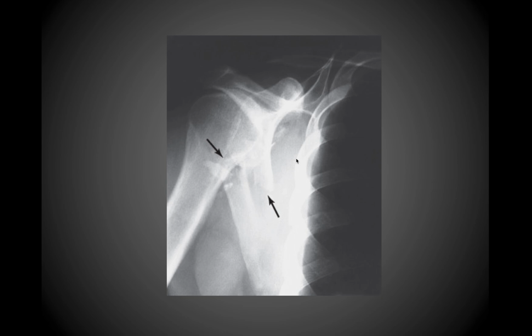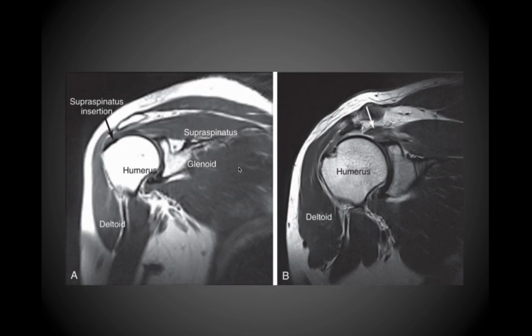And then this is an example of a scapular fracture. So you can actually see a couple of different scapular fractures, which are pointed out by the black arrows in this case. But in any event, that's another thing that you want to be evaluating when you're looking at the upper extremities. So when you're looking at the shoulder, in addition to evaluating the clavicle, the acromion process, the proximal humerus, coracoid process, you also want to be looking at the body of the scapula. And in this case, you can see a very clear fracture. There's another fracture up here as well.